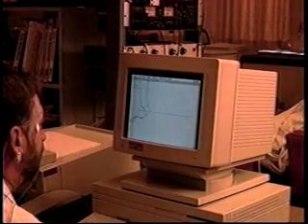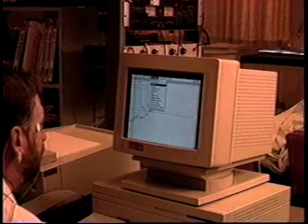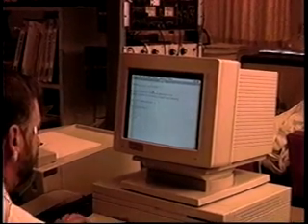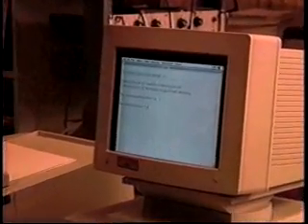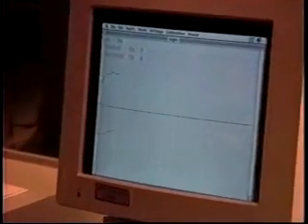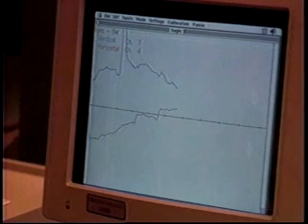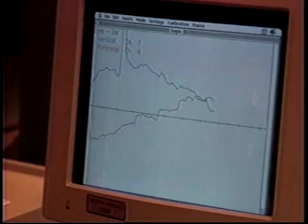The raw signal as displayed was jerky. We have been working on methods for smoothing out the signal. Here is an example of a damping function being applied to the incoming vertical and horizontal signals. Notice how the cursor movement is much smoother.